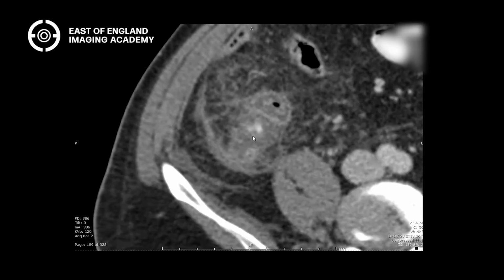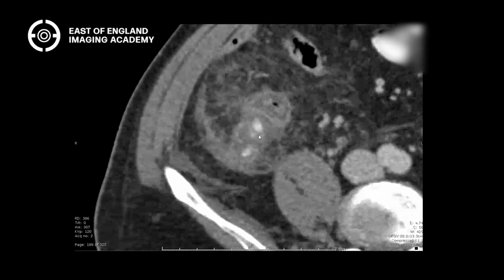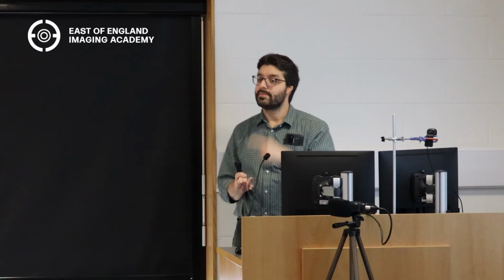Yes. So now we've confirmed that it's not only gangrenous, but it's perforated. Because these are further fecaliths that have spilled out into the peritoneal cavity adjacent to the appendix. Does that make sense? Because we know that they're not in bowel. You can actually see that they're not in the line of where the bowel is, right? So we've not just stopped at this is appendicitis. We've said this is gangrenous, perforated appendicitis with spillage of fecaliths into the surrounding tissues.